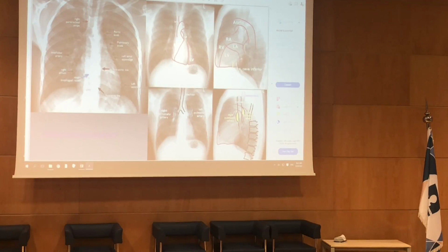So once the heart and the diaphragm join together at their interface, the organs that are below the diaphragm are similar in density to those of the heart. Everything blends in, and you cannot differentiate one from another, okay? But the right diaphragm, you need to see it all through. If you don't see it, then maybe there is a defect in the diaphragm, maybe there is a hernia, and we'll see images later.